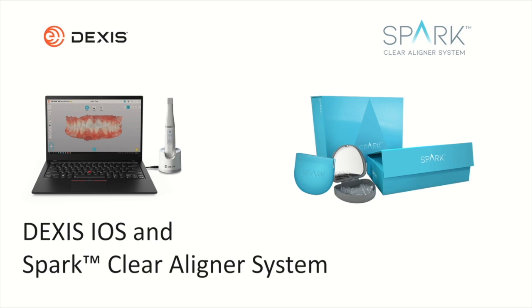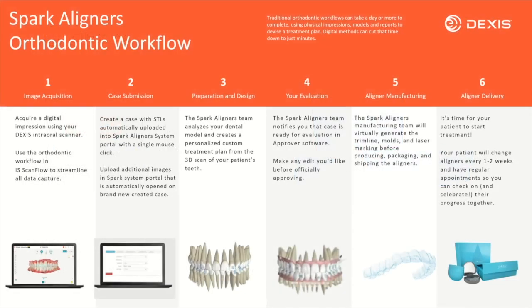The next one is Spark Clear Aligner system, and here you can see the full workflow. Basically, if you use a DEXIS scanner and want to order aligners from Spark, it's a very easy and fast process. After you acquire the scan, you can share it with Spark with just one click, so there's no need to export and import any STL files. With this workflow, you can start treatment and achieve expected results without a long preparation process, which is much easier both for you and for your patient.